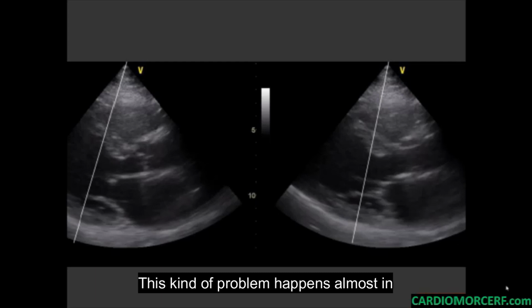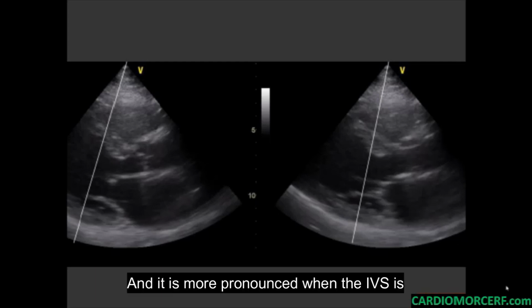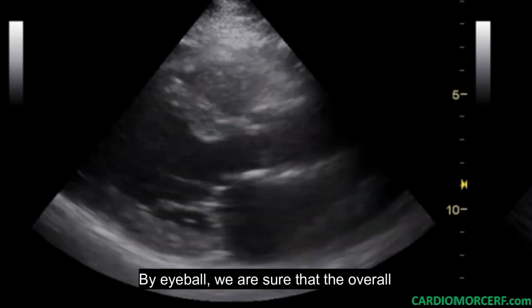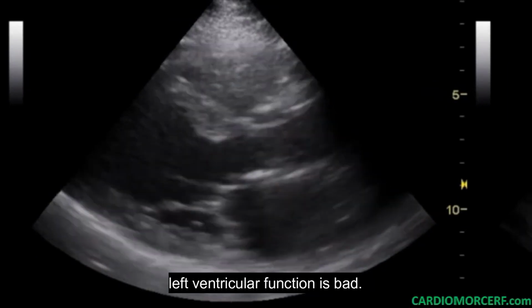This kind of problem happens almost in every patient, and it is more pronounced when the IVS is too much anteriorly angled, or there is a bulge at the basal anterior subaortic septum. Look at this patient. By eyeball, we are sure that the overall left ventricular function is bad.